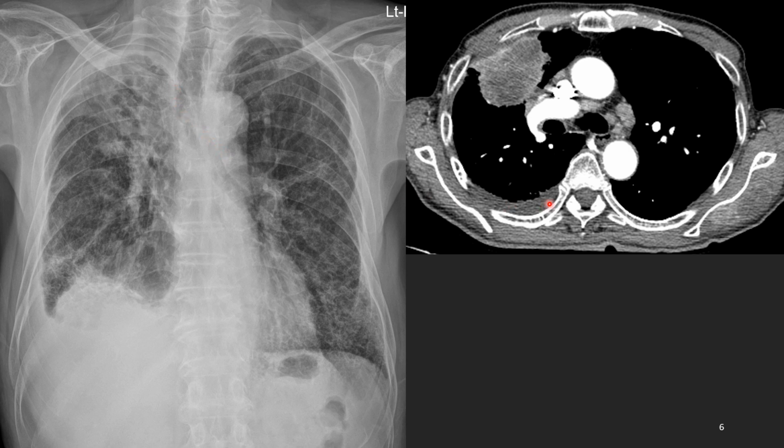Let's see the axial contrast-enhanced CT. This is a right upper lobe mass, more than 5 cm, about here, with pleural invasion, and bilateral mediastinal lymph node enlargement. That means N3 staging. And pleural effusion, probably metastatic pleural effusion, stage M1A. And this is another enhancing nodule in muscle. This is muscle metastasis, M1C staging. So this is advanced staging.